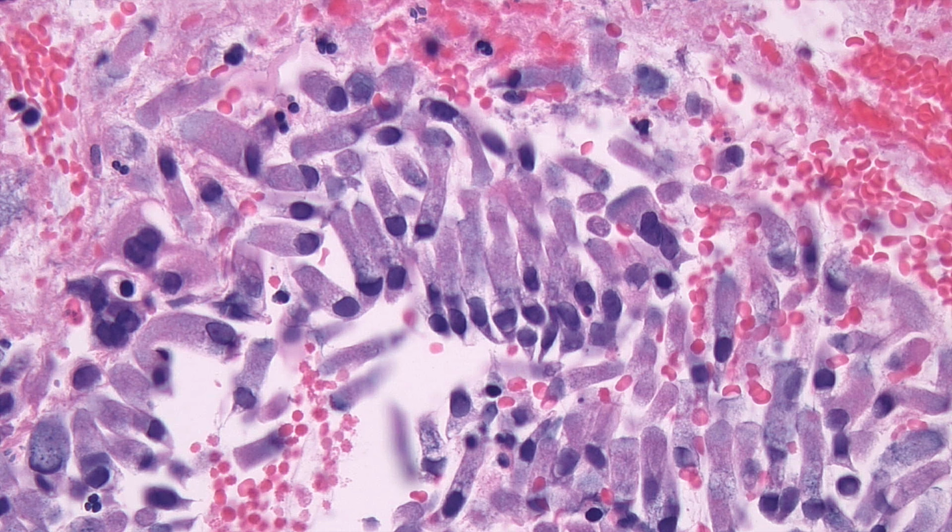So normal endocervical glands are noted here in an endocervical curettage specimen, which honestly is where practicing pathologists encounter these cells very frequently. You can see basally oriented nuclei with a columnar shape and apically oriented mucin.